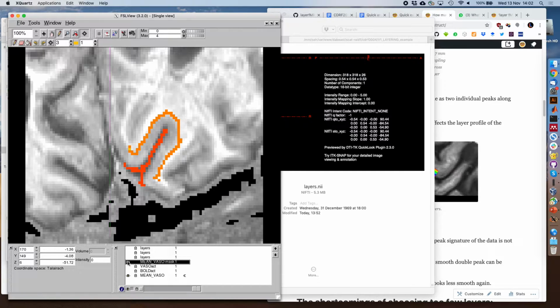Does that make sense? I'm not sure if I understand it. So in the middle of gray matter, we would assume that the whole voxel in the original resolution had information about functional activity. But at the edge, you're probably losing some of that. So some of that statistical power will go outside of your ROI, and some of it will go into your ROI. And I'm curious if you have any thoughts on whether that's an effect.